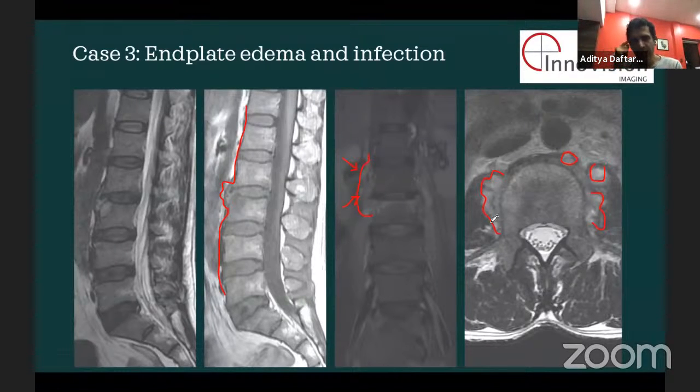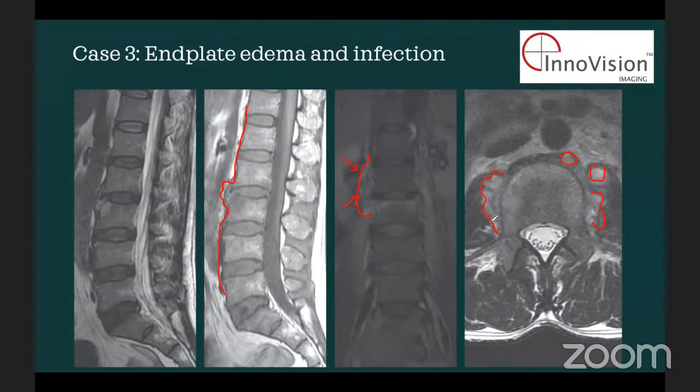But what you do need to be alert to is that each and every one of those could be infection. So your due diligence is to look and make sure that you don't see any adjacent collection. Is that clear? Yes, sir.